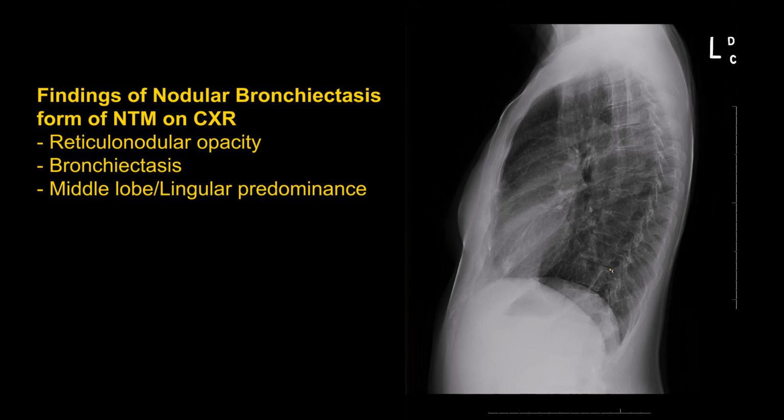Now, based on this, I don't think I could definitively say that this is nontuberculous mycobacterium, but the distribution of disease, with disease in the lower lungs and in particular the middle lobe and in the lingula, I would certainly be raising the possibility of nontuberculous mycobacterium.